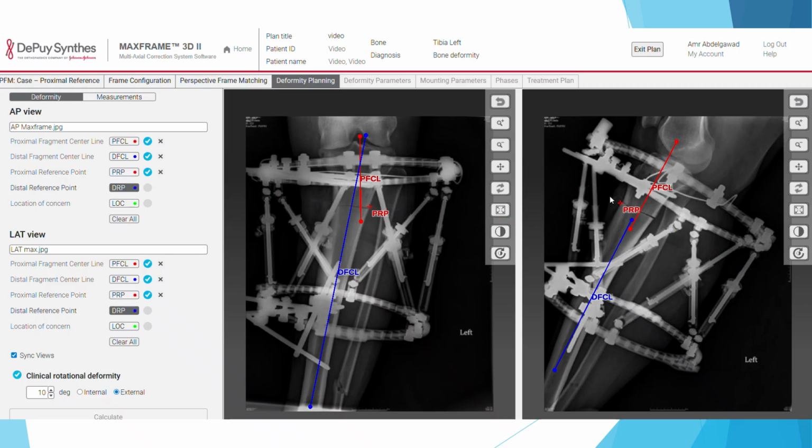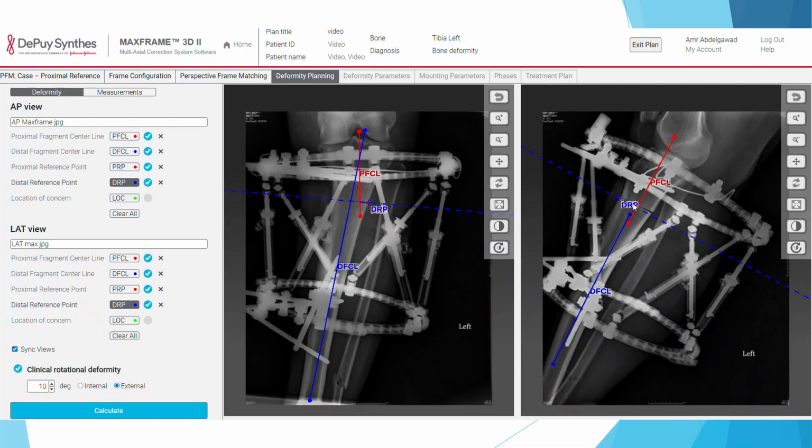And then the distal, if you click the distal here, that gives you the line which is on the same line here. So you click it. So always try to put the line on the dot on this line. Otherwise, it will confuse the software.